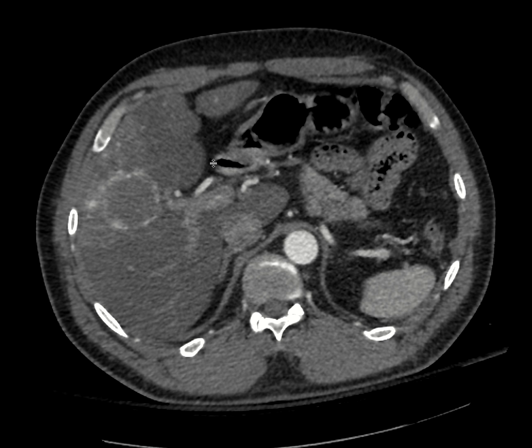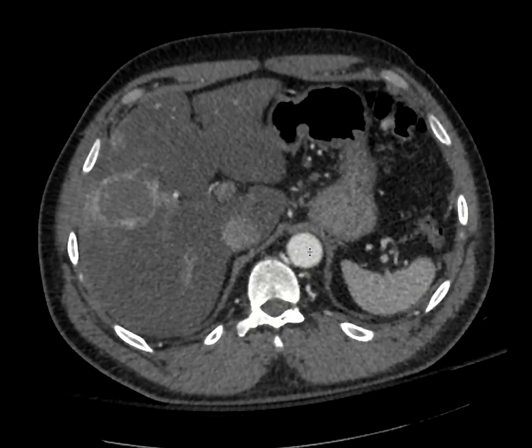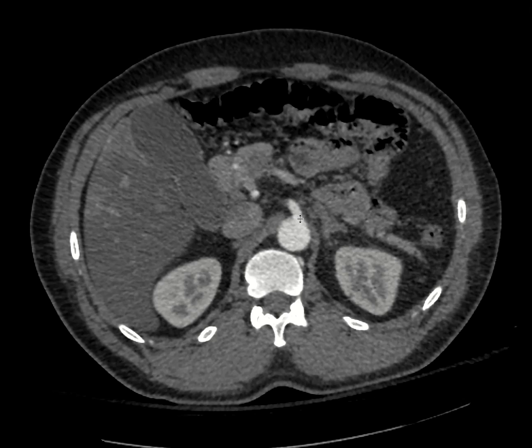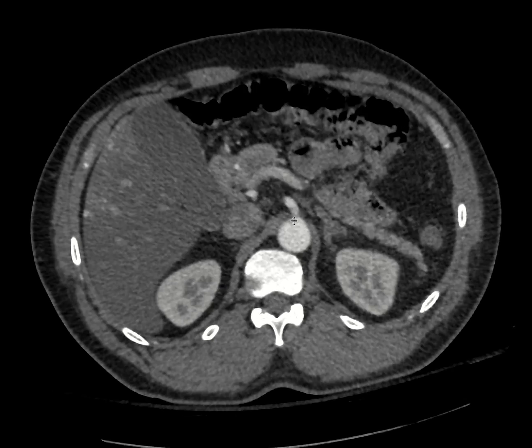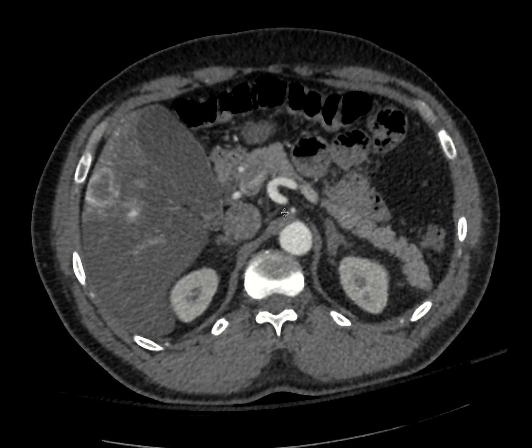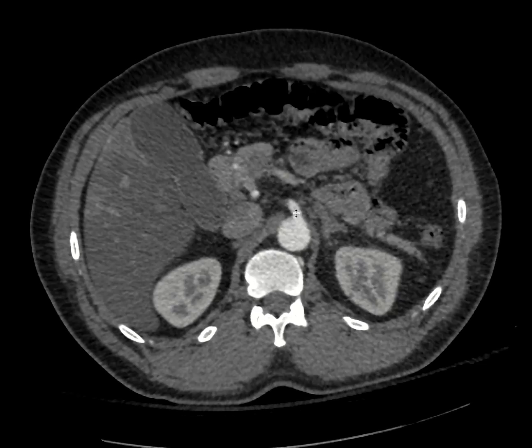Let's look at the hepatic arterial anatomy in this patient who has a contrast-enhanced CT scan. Now, when we're looking for the hepatic artery, one of the good ways to start is you see the aorta here, you find the first branch off of that, and the first major branch off of it is going to be your celiac axis. Your celiac axis usually trifurcates into what you can see here is your splenic artery.